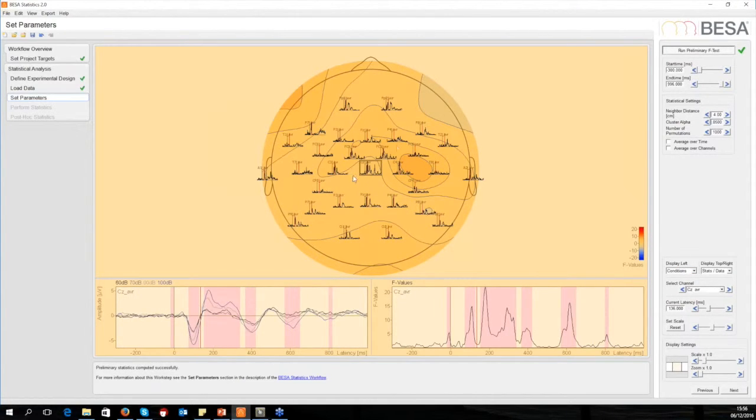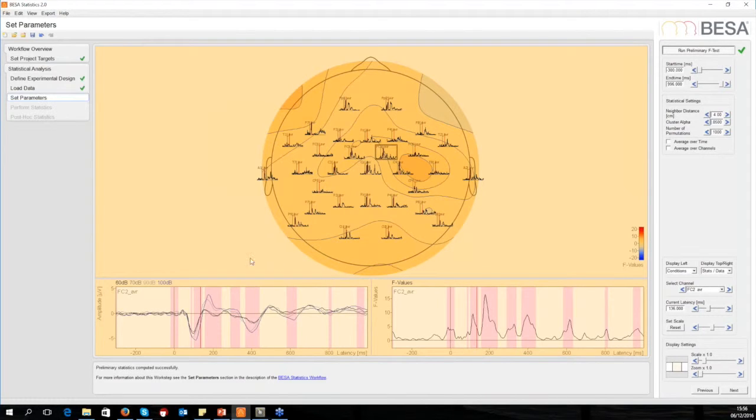Yeah, and these mainly red boxes here are the masks that show me the initial test showed a significance. So there's plenty going on, even at around 0 stimulus time. Let's try and bring some order into this chaos by moving further in the workflow. I have 3 settings up here on the right where I can make adjustments.